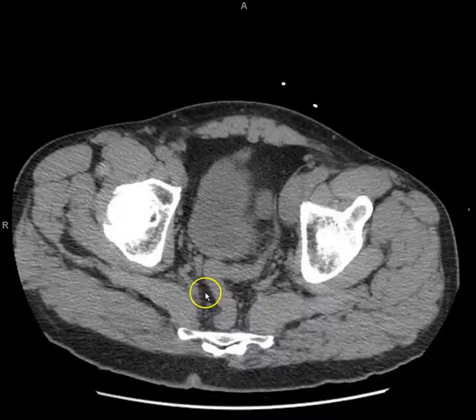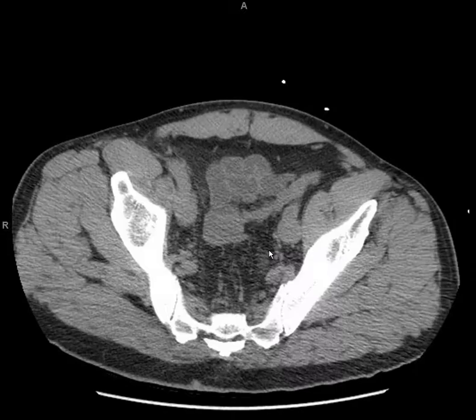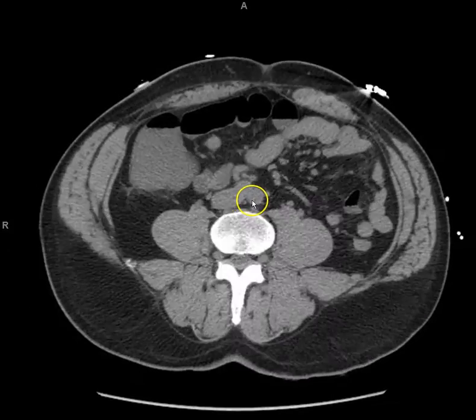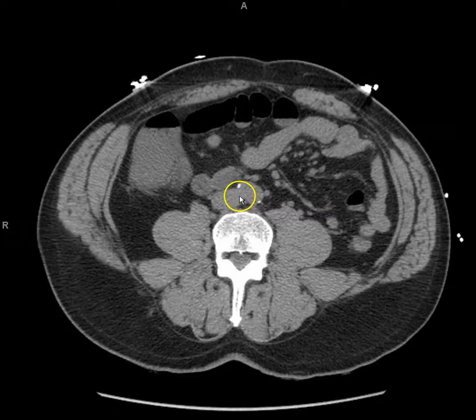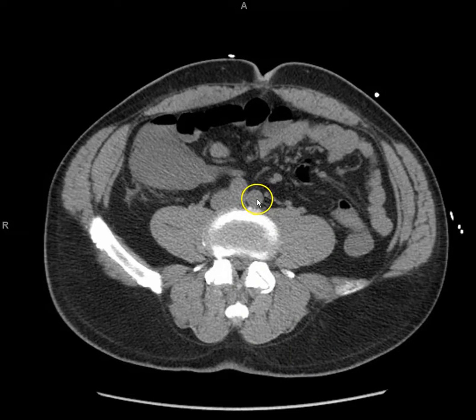If you come down here, he's going to look for the ureters, but you can't really see them. Okay, let's go up and see. He doesn't have contrast, so it's hard to see, but what's this still? That's the aorta, abdominal aorta, descending, and this is? Good. I'm going to keep going down. Now you see it split into two. Yeah, left and right common iliacs.